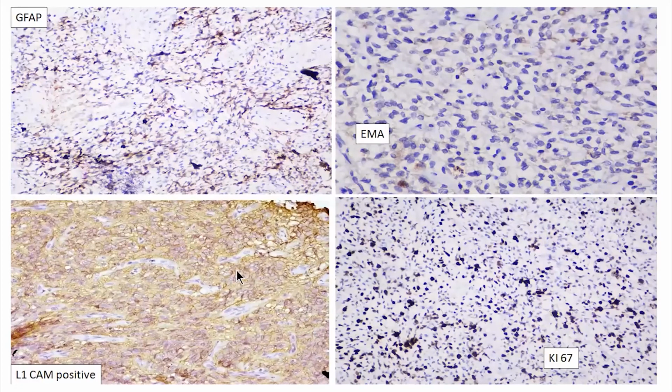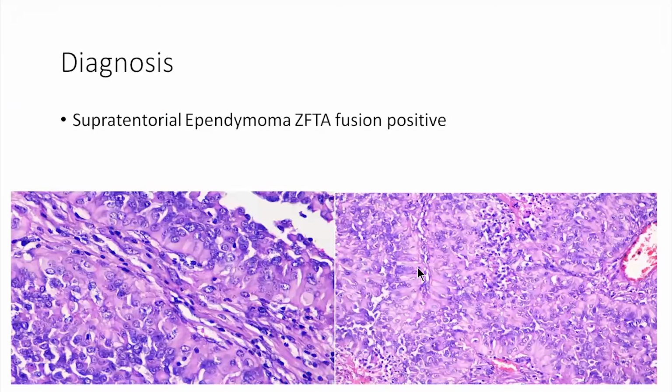In this picture, I have included it because one case came to us, whether it's an ependymoma or some other entity. While turning the pages, I could see that there is one entity, astroblastoma MN1 altered. This is very typical of that morphology, and that is again supratentorial. This entity also shows EMA positivity. This is also negative for Olig2, but the morphology is very different.